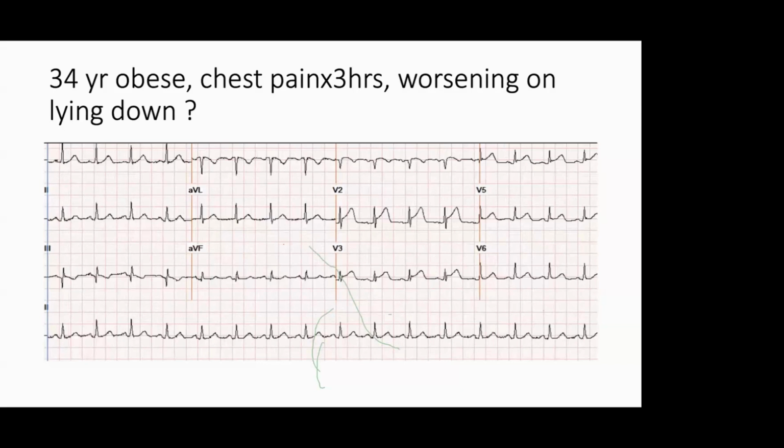In V2 and V3, there is hyperacute T wave and subtle ST elevation. Yes. In lead 3, there is a reciprocal wave. This is a clear-cut, more than evolving myocardial infarction. Q wave that is more than 25% wave. Not clear actually. You told correctly, fully clear. This is an anterior myocardial infarction.